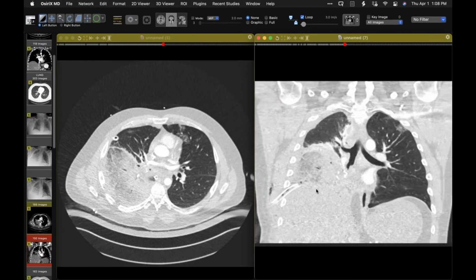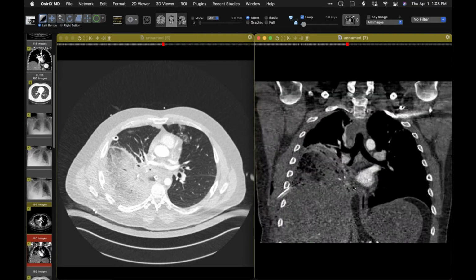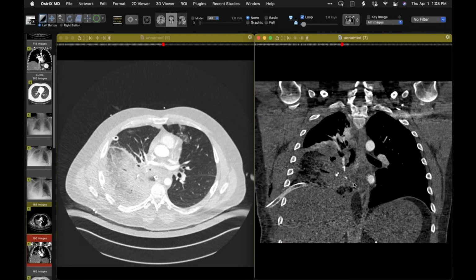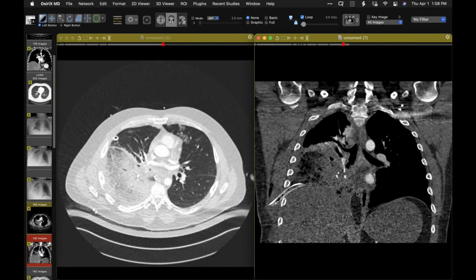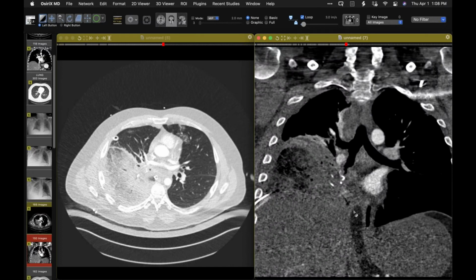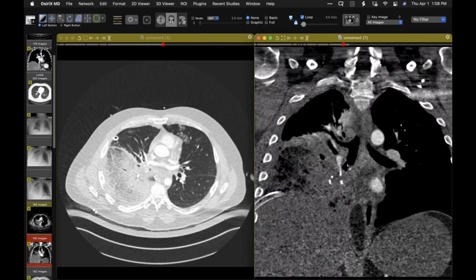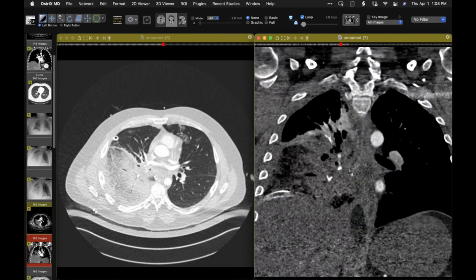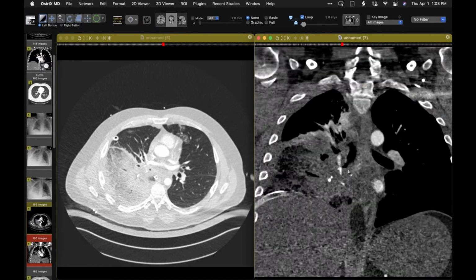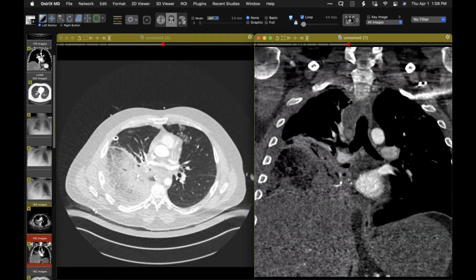Now, what I want to do here is show you the location of the staples in the right lower lobe where the lesion was, and I'll make this a bit bigger. So, for example, here we can see where the opacified pulmonary artery is, beyond which we don't have opacified vessels, and the relationship between these staples and it there.